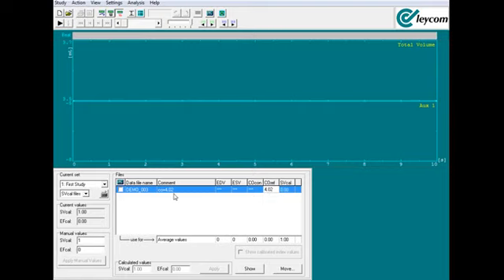The reason why we typically name this file cardiac output equals the value is so that one does not have to remember what this value is when inputting the reference number. Likewise, if I didn't have this pre-recorded, I can always make a copy of the baseline file and name it cardiac output equals whatever. After I've inputted this number, be sure to select the check mark such that these average values at the bottom populate.